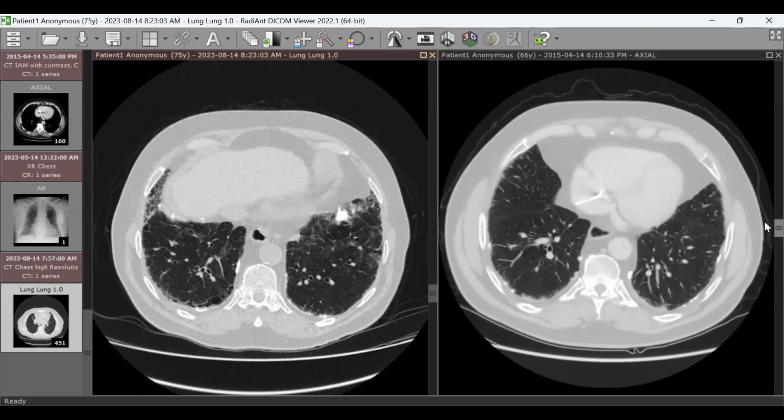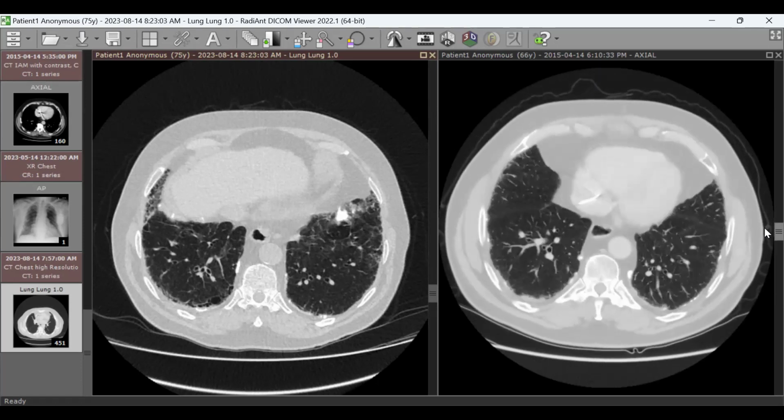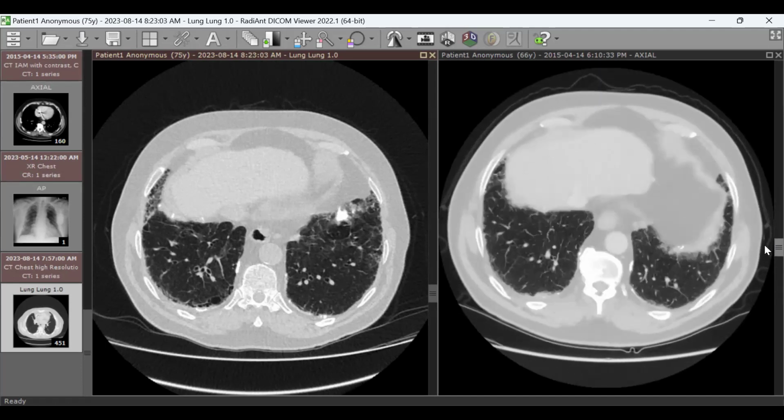So the main diagnosis is asbestosis with amiodarone toxicity. And the only thing now is how to differentiate and see what's the main reason. After that, I checked the medical records yesterday. The clinician suggested to the patient that they will stop amiodarone and check after a while to see if there's a change in the appearance of the lungs. And by that, you know why?